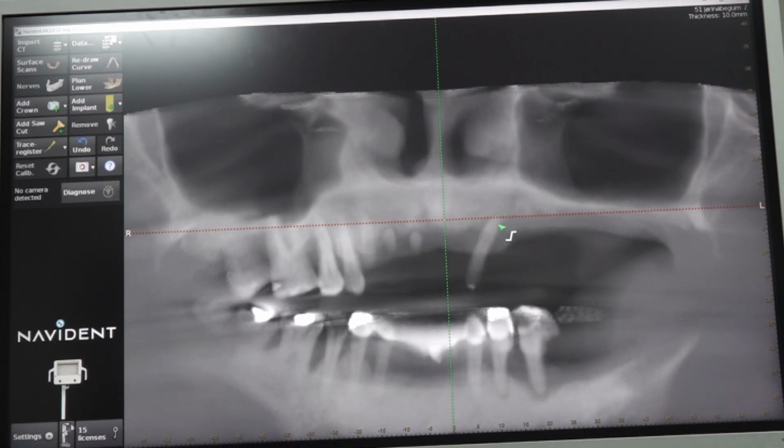This is probably the canine tip, right? This is the 4. So the 4 is not great. 5 is gone, right? So almost like it is similar on both sides. Here the 5 is not favorable, close to sinus. Here also it is tentative, even though it is edentulous, in imagination you see the 5, the sinus is closer. 4 is somewhat okay, but you have to tilt it easily.